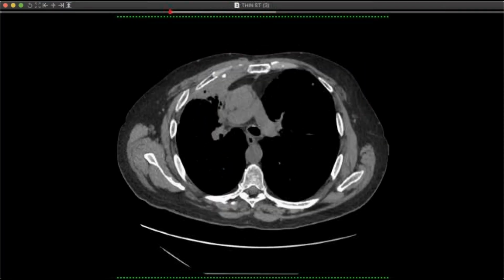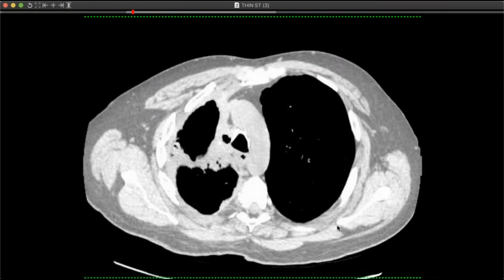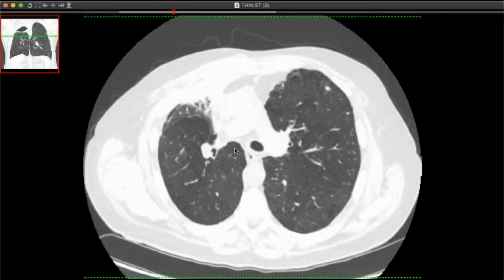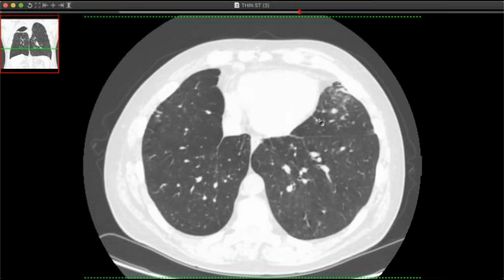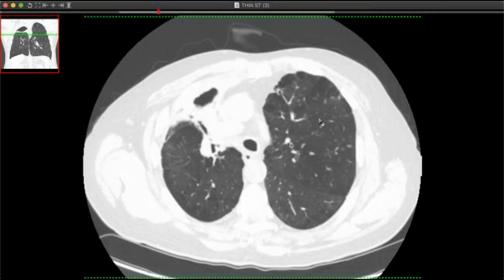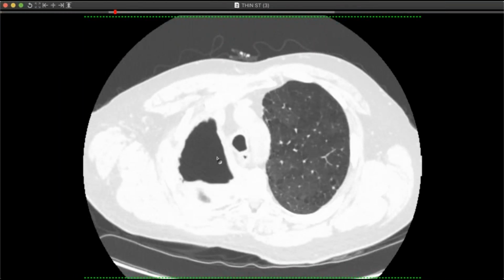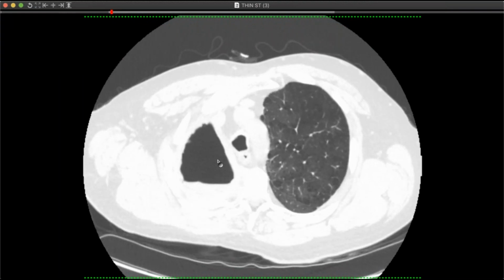So this patient had a right upper lobectomy a long time ago, and has had problems with a bronchopleural fistula. And this is a nice example where you can actually see the bronchopleural fistula. It's thought to be complicated by non-tuberculous mycobacterial infection, and that's what all this brouhaha is in the lingula and elsewhere. Those nodules kind of wax and wane, and they've never really been able to get that under control. And you can see the middle lobe is pretty trashed. So they've tried to treat this bronchopleural fistula. They tried drainage, and then they put a muscle flap in here at one point, and it didn't do well. So they came back for a bigger flap.